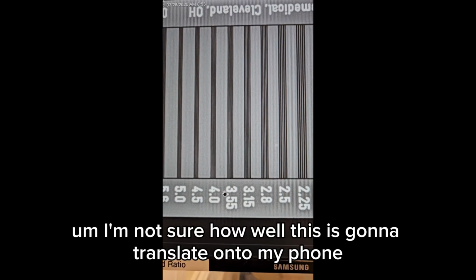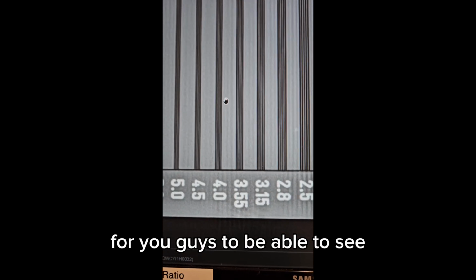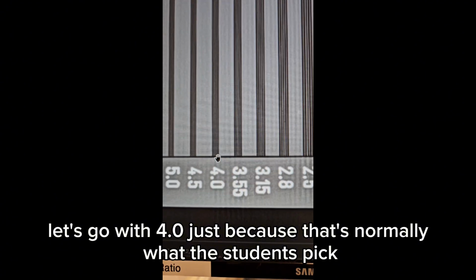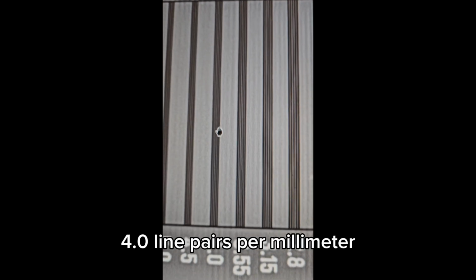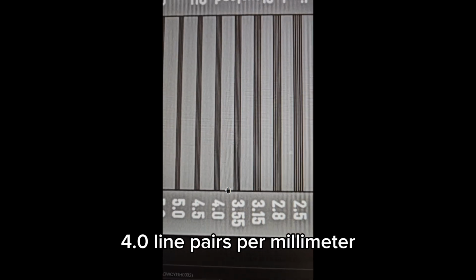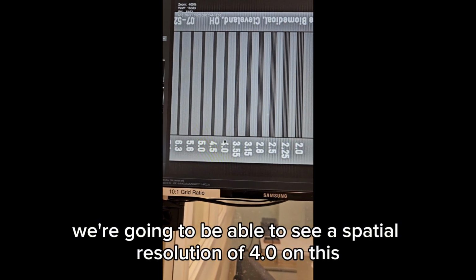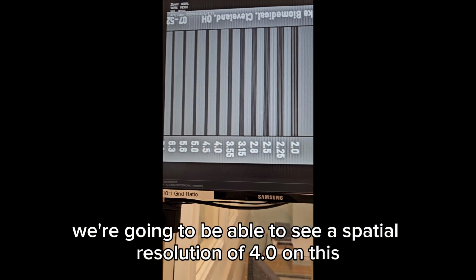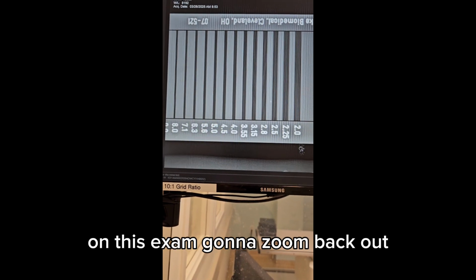I'm not sure how well this is going to translate onto my phone for you guys to be able to see. Let's go with 4.0 just because that's normally what the students pick, and I'm totally okay with that. So we're going to say that our spatial resolution is 4.0 line pairs per millimeter, meaning we're going to be able to see a spatial resolution of 4.0 on this exam. I'm going to zoom back out.